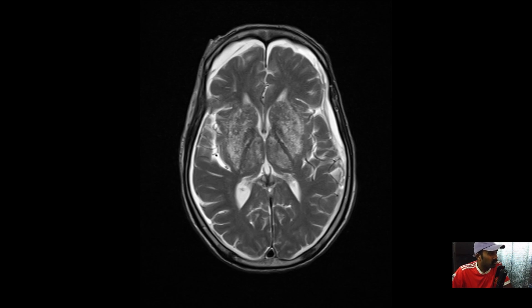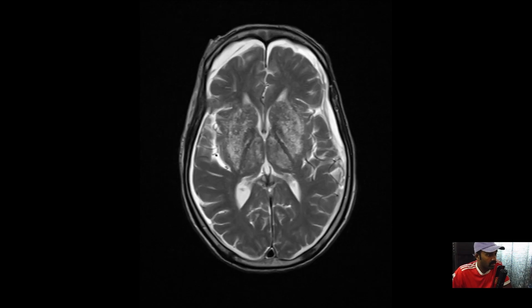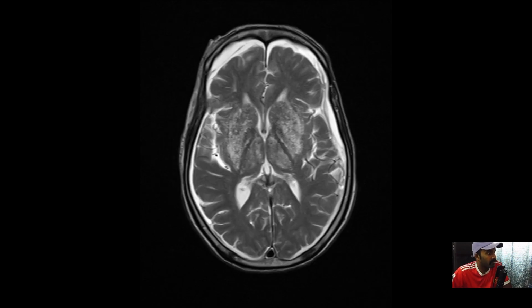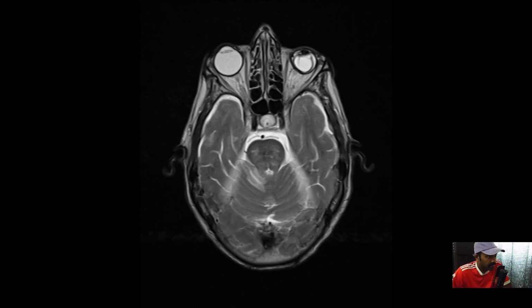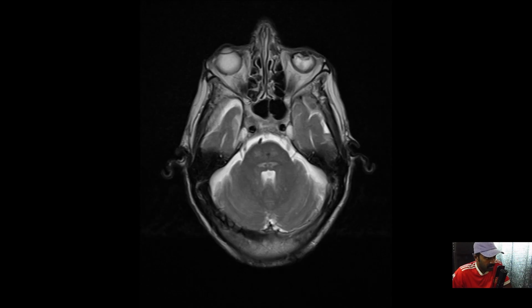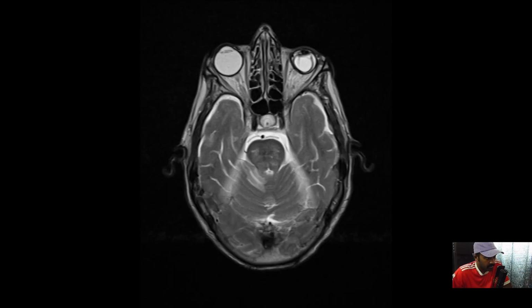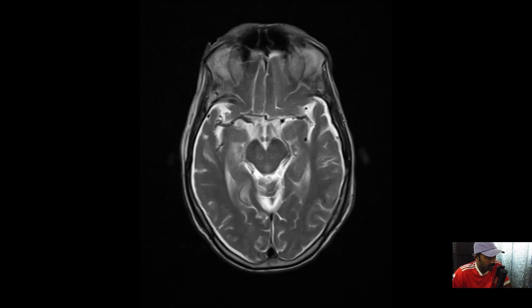So there are two variants. One would be the cystic smaller variant, where you would see just a diffuse small cystic dilatation. You could have bigger areas of involvement when it would be a lacunar form of presentation. Then, of course, there are again T2 signal changes in the pons, some signal changes in the right superior vermis.